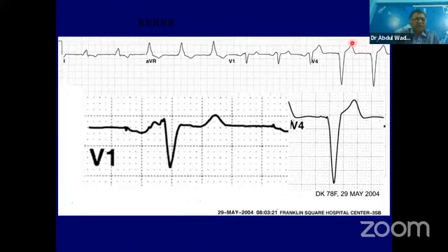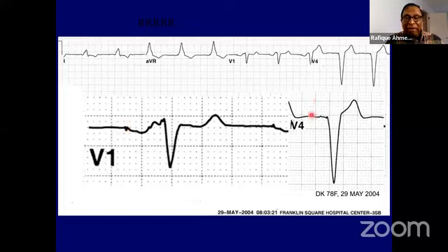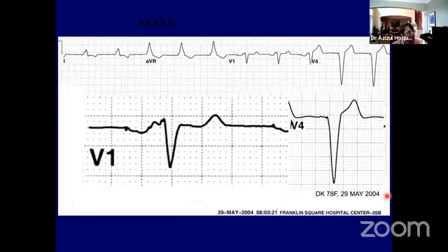Yes. So I have magnified V1, there is a pacing spike, and in V2 the ventricular spike is very difficult to see, but in V4 you could. And Wadud mentioned something important. Lead 1 looks like left bundle, but from V1 to V4, there is a QS pattern. It's very, very unusual for that to happen unless the leads are misplaced.